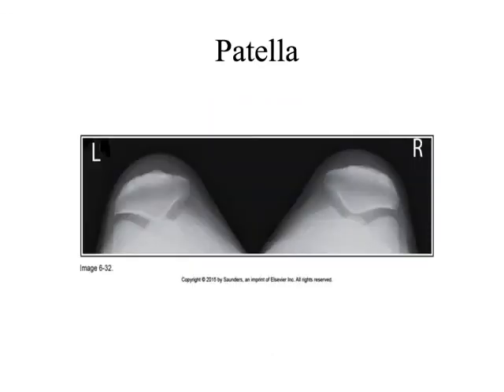Okay, patella. This is a tangential projection. We used to call this the sunrise projection or the merchant method. Basically what we're trying to visualize really clearly is if there's a patellar fracture. That's the number one reason that we would do this image.